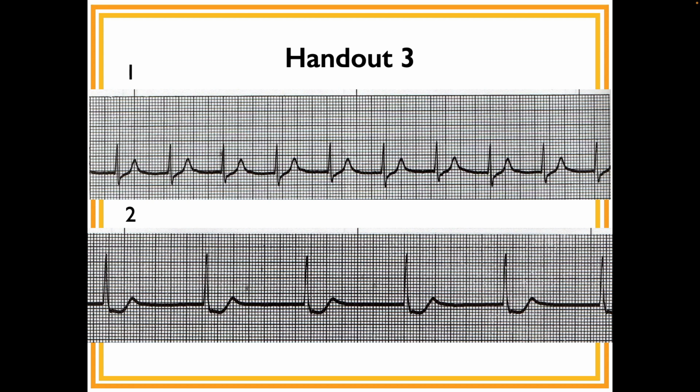By all means, go ahead and say it. Number 2, the rate looks regular, and it's about 50 beats. There's no P wave, so there's no PR. QRS looks good, so a junctional rhythm. Just plain junctional? Just a plain junctional rhythm. Exactly, because it's less than 60.